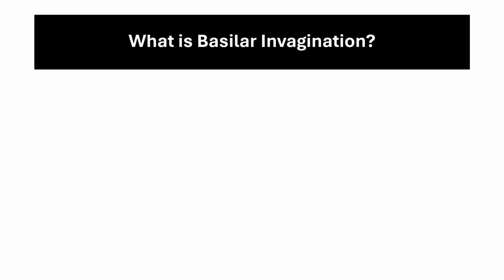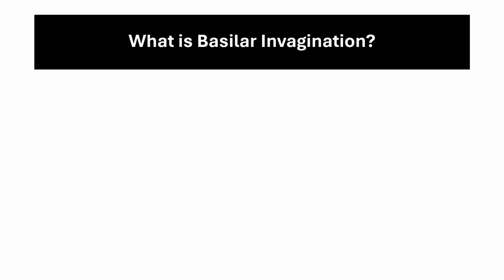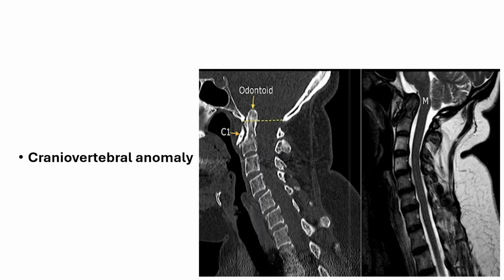Hello guys, do you know what is basilar invagination? So in this video I will describe basilar invagination and the different lines to diagnose it. So what happens in basilar invagination? It is a craniovertebral anomaly, as we can see in this image.